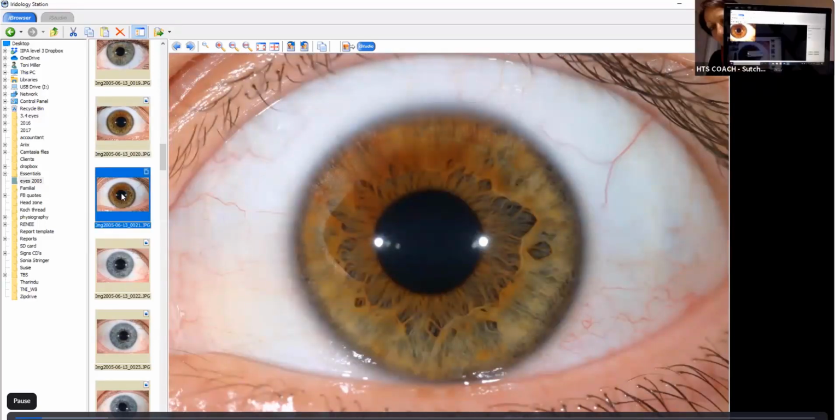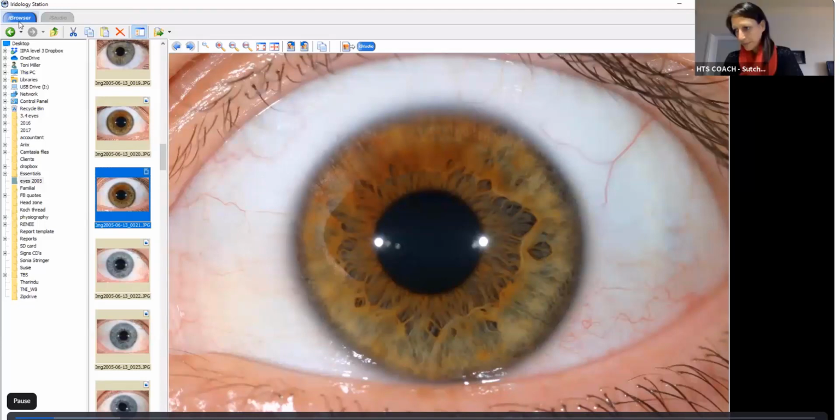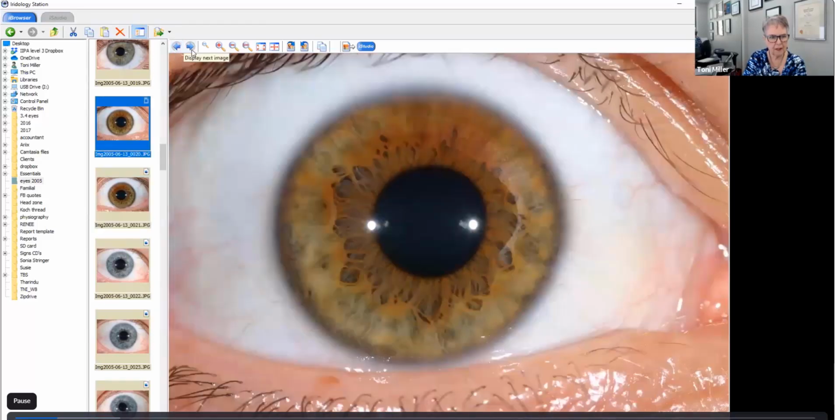So your file that you've opened, I've only got 2 pictures in there. So I've done that, but it isn't a full screen. Are you in the browser section? So in the browser section, I've got the file and it's got my 2 eye pictures in there, and I clicked one of them. Oh, sorry, yes, that's where it's the bigger picture. Yeah, so the browser gives you a full screen view. And you can toggle between the eyes using this little set of arrows that you've got here.